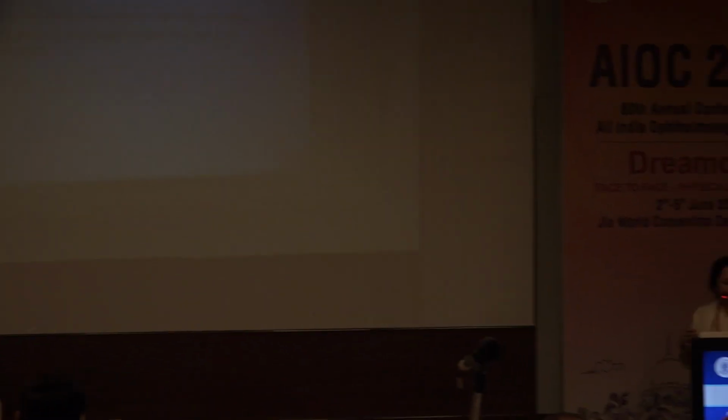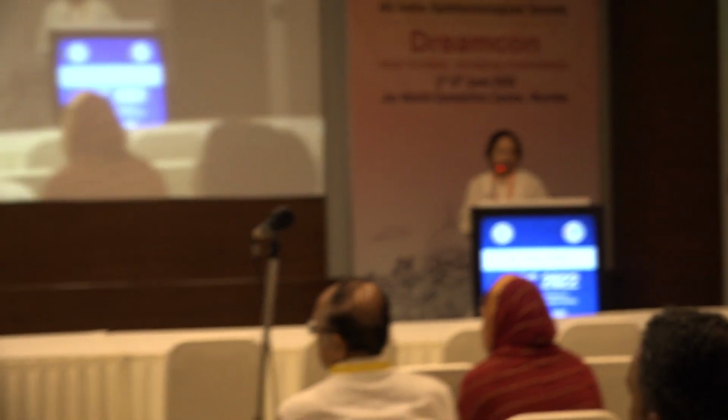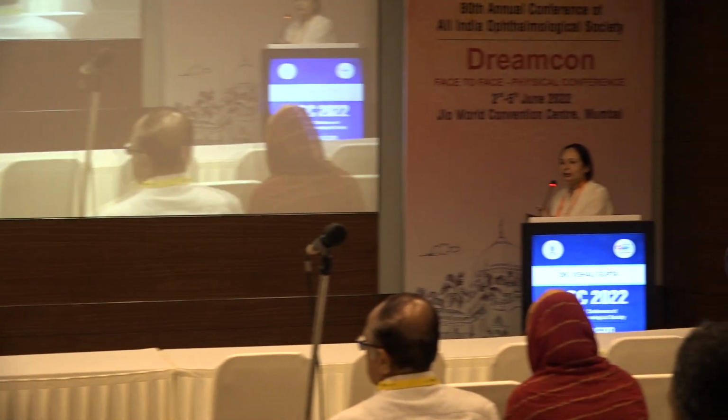Thank you, ma'am. I think that was a very important point, and I remember we had a patient with toxoplasmosis retinitis, and the multicolor photograph was circulated in our groups in Abu Dhabi, and nobody could actually pick up the retinitis looking at the WhatsApp image. So any questions? In teleconsults and all, I think it's very important too, because all of us follow retina like mad, and if retina people are saying it's very good, but for us it doesn't work. Good presentation, Doctor.